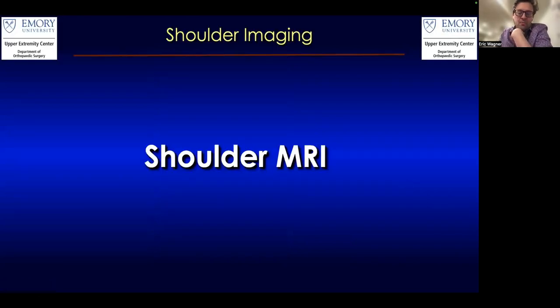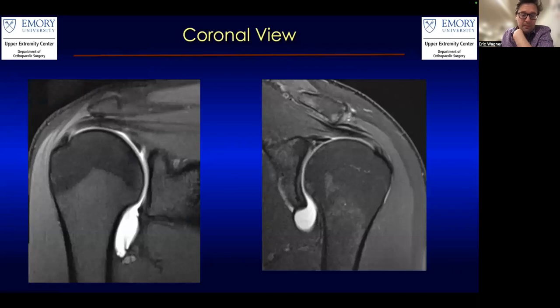All right, so let's talk about the shoulder MRI principles. As you look here, you have a regular rotator cuff. This is your supraspinatus and probably part of your infraspinatus, this black line coming in here and inserting onto this tuberosity, this flat area right here. You can see that maybe there's some changes in signal. So maybe there's some very mild partial thickness tears on this guy, but for the most part, it looks pretty good.